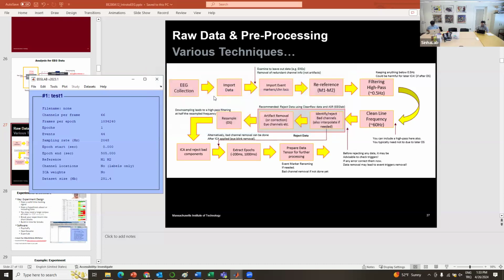So I'm just going to click OK. And here we go. You can see the data set size is reduced by a factor of 10 now. It's just 35.3 megabytes. So we basically got rid of lots of data, but it is most likely not very useful.